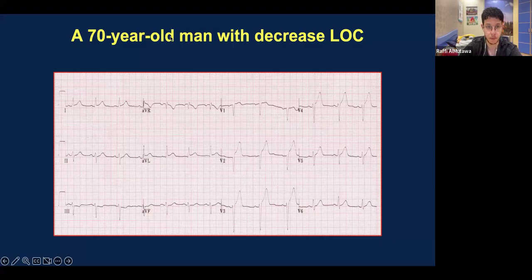Anterolateral MI. Very big words. You could be correct though. LAD infarct. Also a big word. You could be correct though. Okay, only anterior. That's a big claim. Okay, let's look at this. So we said it's probably anterior.